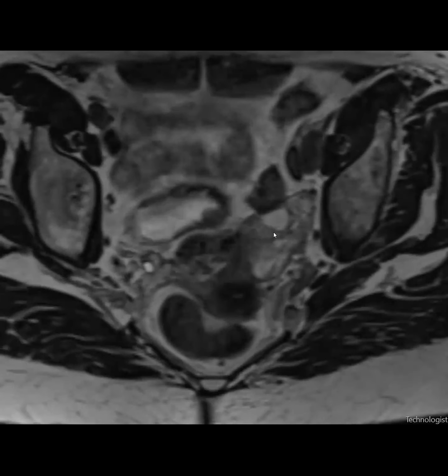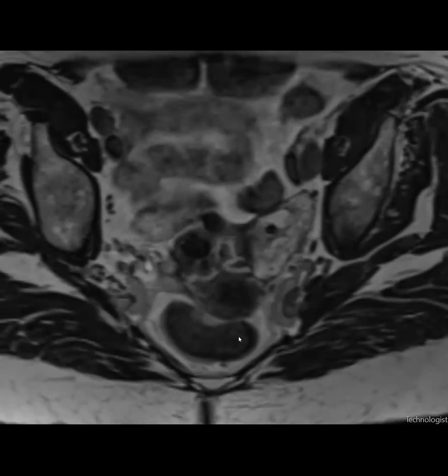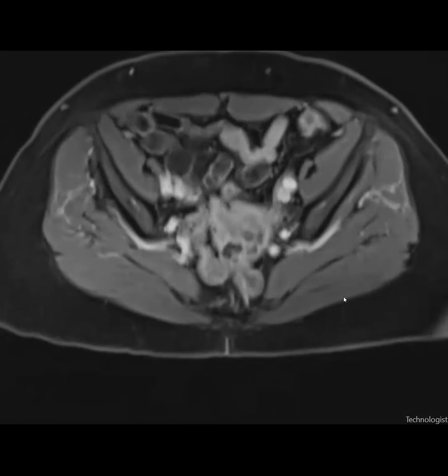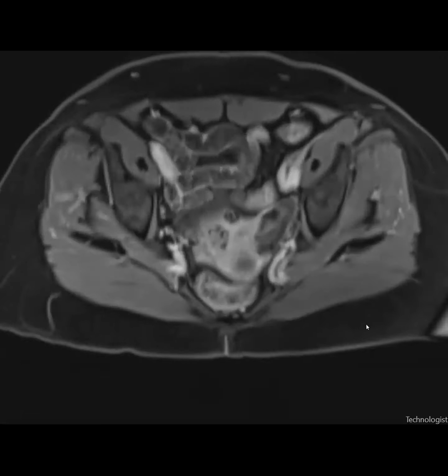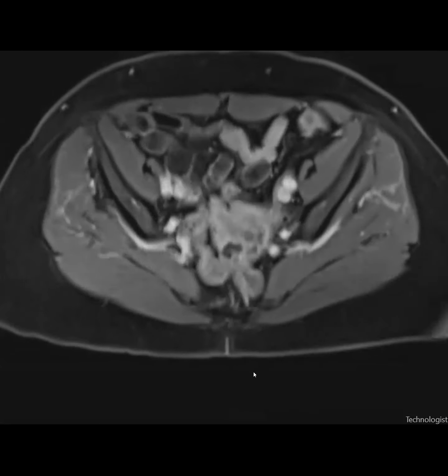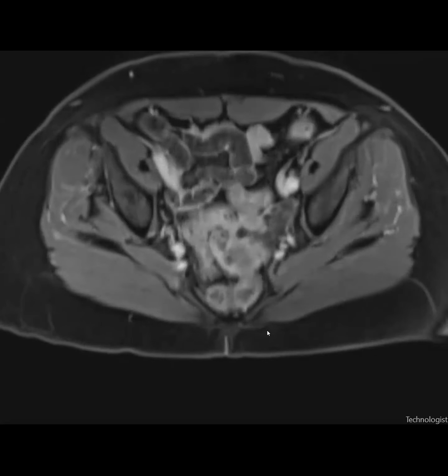I think leiomyomas can be complex, like fibroids can be complex, can look like this, even the myxoid fibroids can look like this. So we just called that a lipoleiomyoma. I'll show you the post contrast. So I guess, Nelly, you're right. Technically, any fatty thing, you can't exclude a liposarcoma, and you're saying it looks like a little bit too complex. We were kind of favoring that fibroids are more common. It's arising from the myometrium. Fibroids can look complex, and so we called it the lipoleiomyoma.